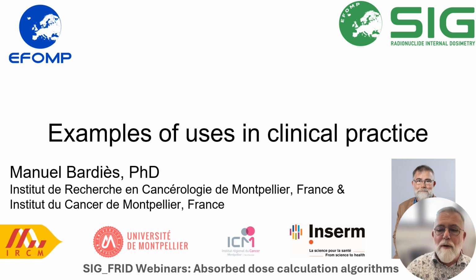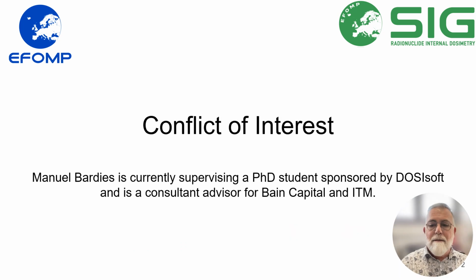Hello, I'm Manuel Bardiès and I'm going to present some examples of use of software in clinical practice. So in this webinar, we're going to compare results obtained in the same settings but using different software.